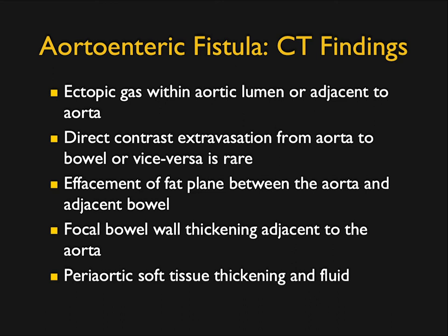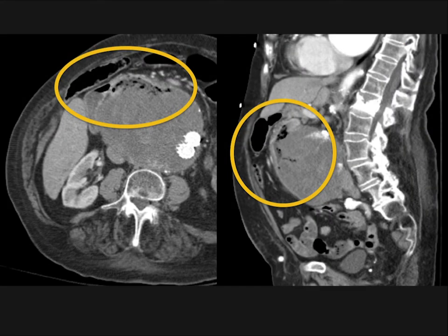Now, it's important to remember it's typically an older population, and most commonly the fistula occurs at the level of the duodenum. So here's a nice example. This patient has an enlarging aneurysm, had already had an endovascular repair, and you can see what's happened here is this large aneurysm has eroded into the patient's duodenum. Just a very, very impressive example. Now, fortunately, they are rare. Again, the importance of the sagittal view, but those are indeed rare findings.